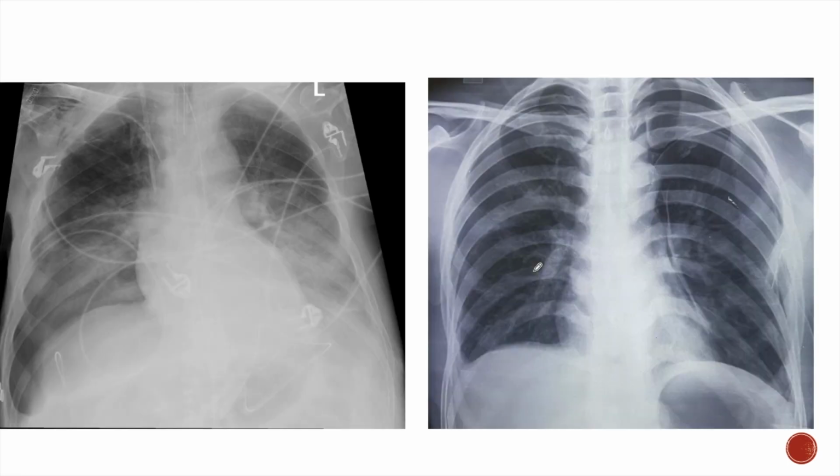Coming to our query, in the first X-ray, who is a patient in the ICU with acutely increased dyspnea, we can appreciate that besides the presence of bilateral perihilar consolidations, we can also appreciate that the right-sided sulcus is quite deep and the right lung appears hyperlucent than the left side. So this is the case of right-sided supine pneumothorax.